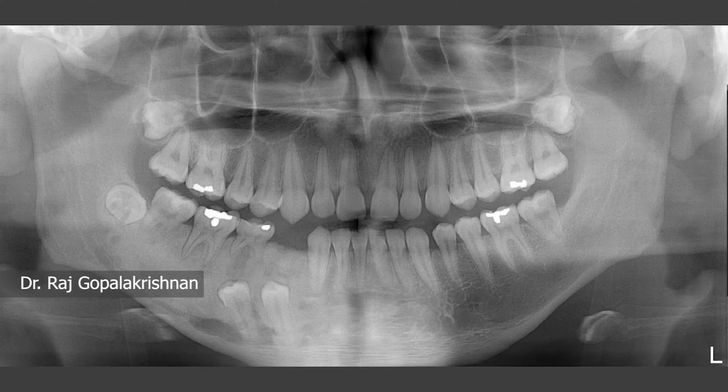As we had seen before, you start interpreting a panoramic radiograph by evaluating if the patient positioning is correct. A panoramic radiograph can have many kinds of positioning error. As we can see, the second right molar is slightly wider than the left side. This means that the right side is slightly further away from the sensor. Similar widening is also seen on the mandible. I'm not trusting the data of the mandible as much because there might be some expansion of the jaw and displacement of the teeth. Other than this rotation error, this panoramic radiograph is very good for interpretation.